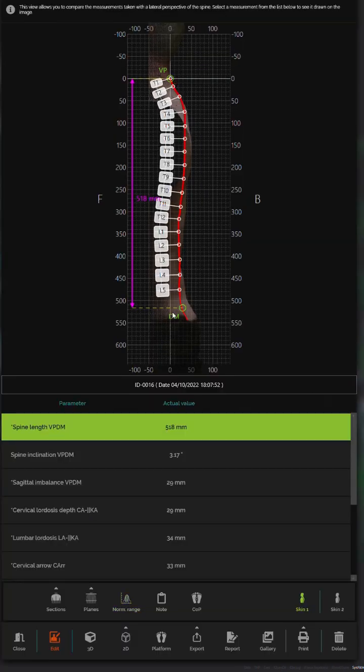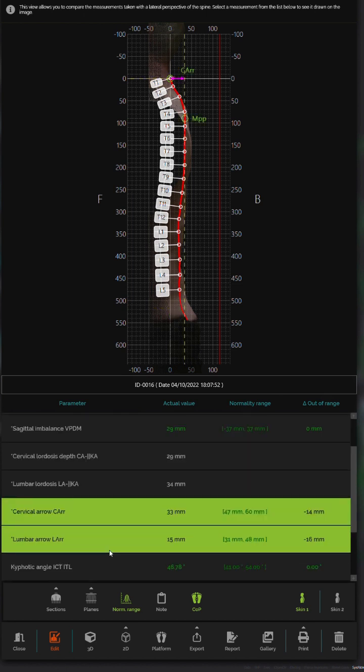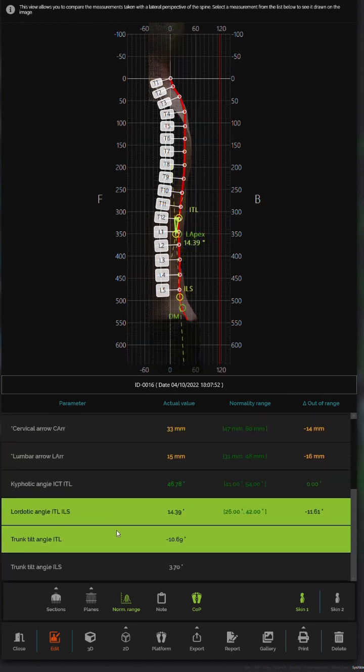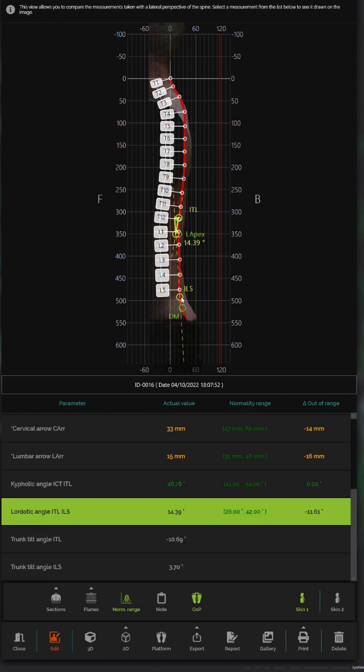When we look at the sagittal view, we can actually see overall this patient probably has quite flattened curves, particularly lumbar curves. So if we're clicking the normative values, you can see there's quite a lot of orange data showing that there's data within those sections outside of the normative range. And so he has a slightly increased upper thoracic curve, but a flattened lower thoracic kyphosis, and then very, very flat lumbar lordosis.